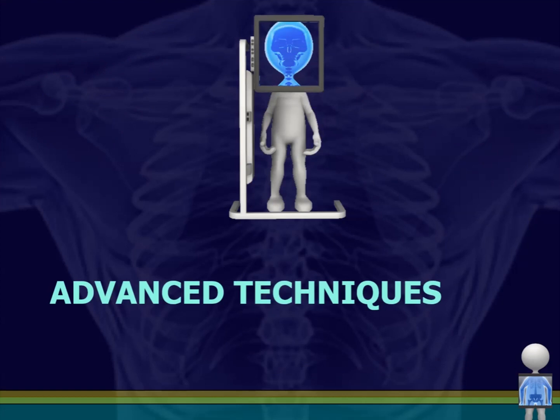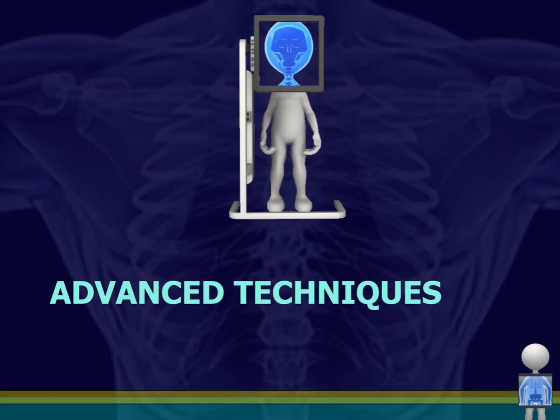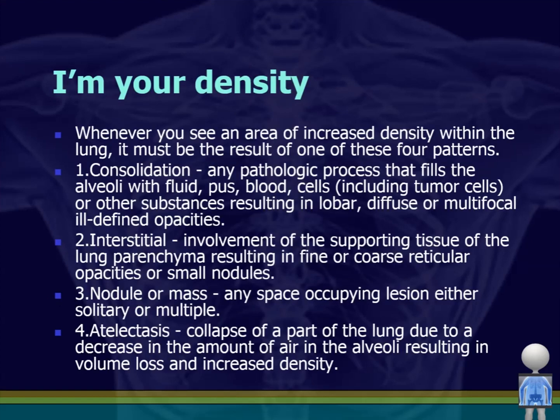Let's go a little further into how we might evaluate our chest x-ray. Now, for every one of the x-rays we're going to do going forward, I am not going to go through the 12 steps, or it would take us 6 hours to do this, correct? I'm just going to be focusing on what pathology I want to show you in that film and how that might present. Remember that in reality, however, on every film that you look at, you are going to check everything.